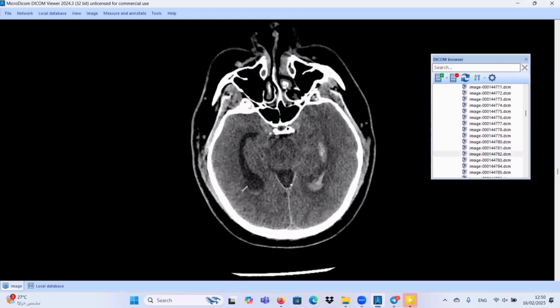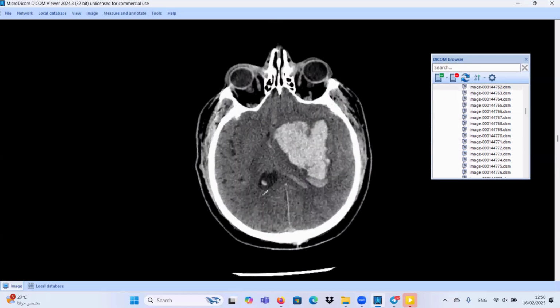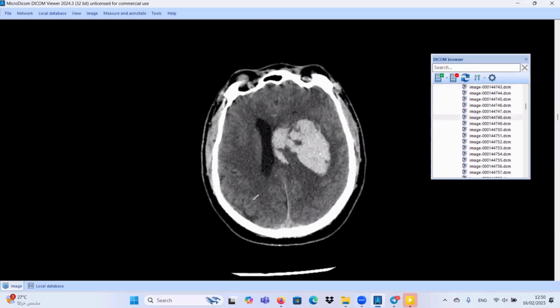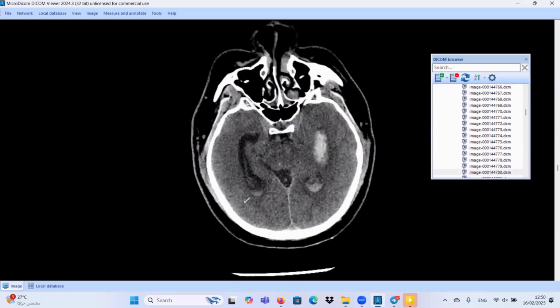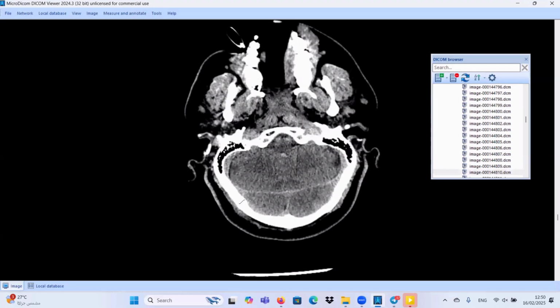We have also here in the axial plane effacement of the basal cistern here. It's totally effaced, the ambient cistern. This one is suspicious for descending transtentorial brain herniation. Please revise our previous video for the brain herniation, because this one is highly suspicious for brain herniation.